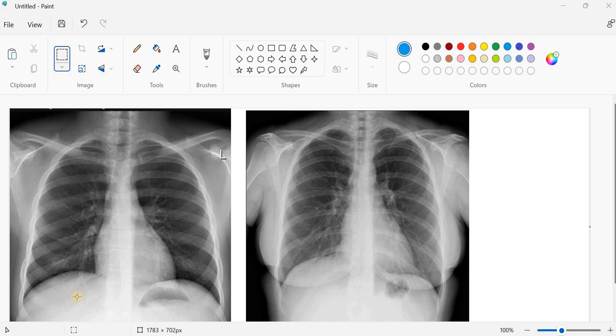First, when we are talking about A, let us talk about the airway. The airway, if you are going to talk about it here, it is represented by the centrally located trachea. So this is here, trachea, which will appear as a tube translucent in color. So translucent in color means it is dark gray because it contains gas, obviously. So this is a trachea.